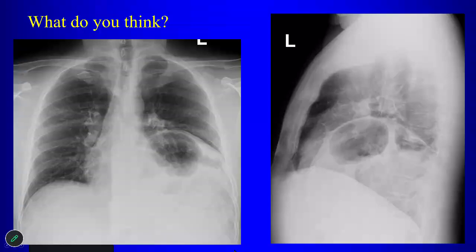Okay. What is abnormal on this chest X-ray? The left hemidiaphragm is elevated. Yeah, now if there's elevation of the diaphragm, especially on one side, there are two major things that can cause that. What are the things we think about? Phrenic nerve paralysis is one, and the other is eventration of the diaphragm, where there's weakness of the diaphragm that allows it to elevate. How do you differentiate the two? Sniff test, right. So how does that work?